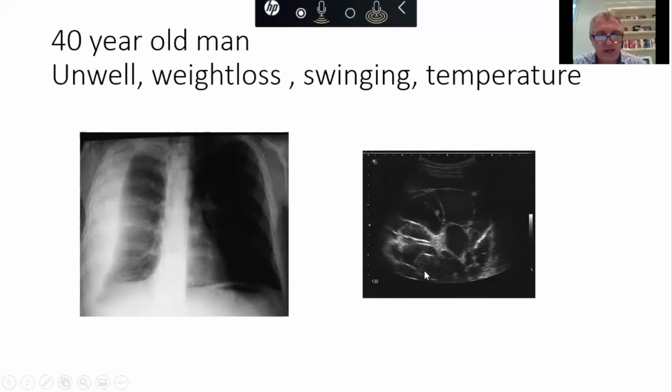We do an ultrasound. So a pleural collection, it's unilateral, most likely to be an exudate, high in protein content, most likely due to infection. And then we've done an ultrasound, and there is fluid here, and there's also lots of proteinaceous loculi, indicating that it's high protein and most likely due to infection and empyema.